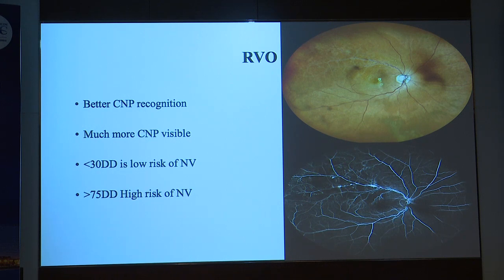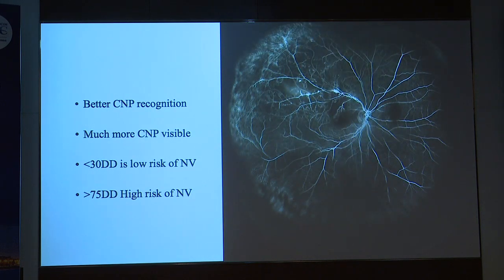So now the concept, even in a case of vascular retinopathy, of going beyond the equator to complete a sectorial or a pan-retinal photocoagulation, you are justified in doing. Otherwise a standard teaching would be to treat up to the equator, moving from the vascular arcade up to the equator. But these cases will convince you why you need to go beyond the equator. Now this is what the ultra-wide field is. You see the extent of the damage.